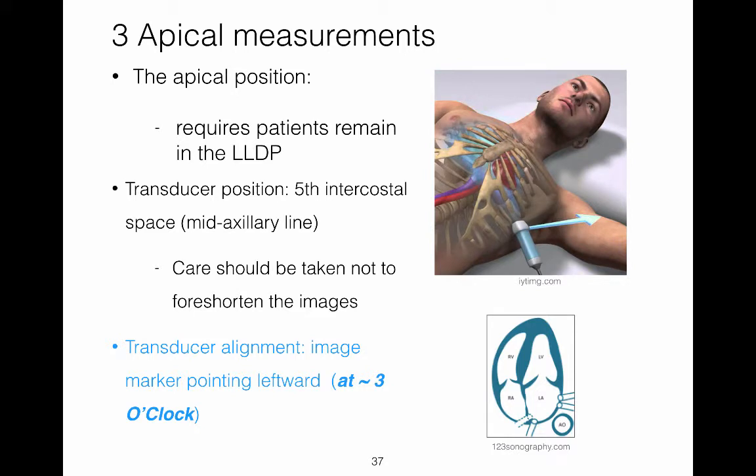Apical measurements. Patient positioning, transducer positioning and alignment for apical images were described in preceding lectures. This slide serves as a reminder of how to position the patient and the probe when acquiring apical images.